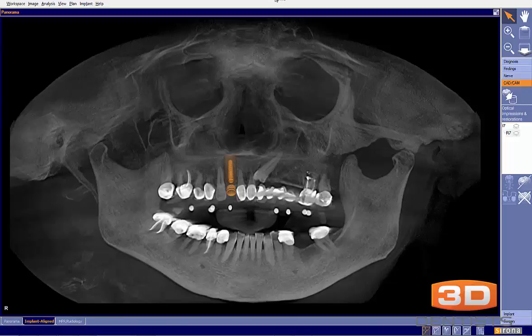All right, I've been on a little bit of a hiatus here, and we've been sent a case. Looks like our patient is missing a tooth in number 7, also in the upper left, but looks like our plan is here for number 7.